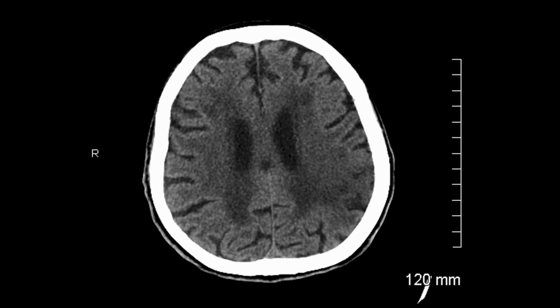So the way this is going to work, similar to the other parts, I'm going to present you with 3 different cases, give you about 30 seconds to review the images. Feel free to pause anytime you want during the video, and then we'll go over it. Image 1 of 1.